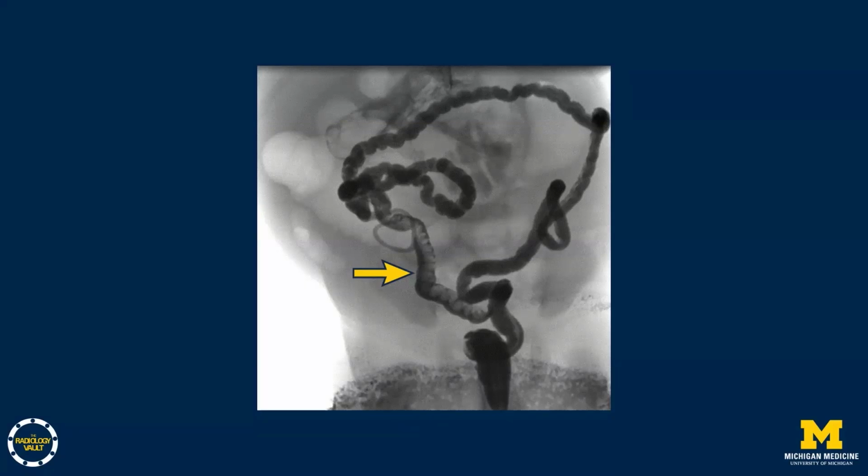In this particular patient with meconium ileus, you see contrast within the upper gastrointestinal tract. It is faint, and that was related to a previous upper GI performed for potential bilious vomiting. Again, another example of how a distal bowel obstruction can lead to bilious emesis.